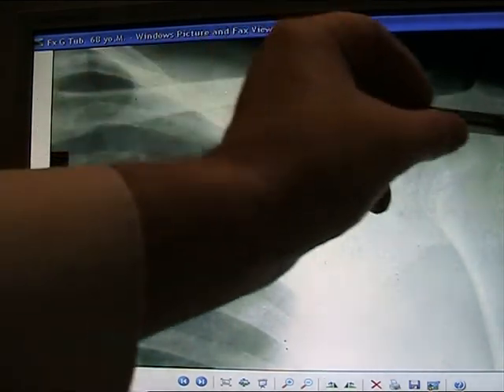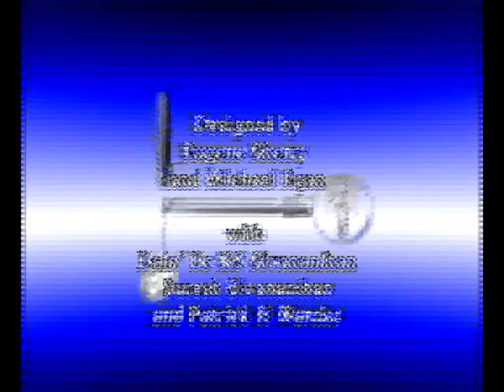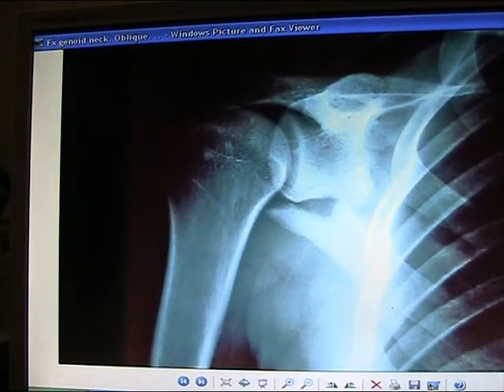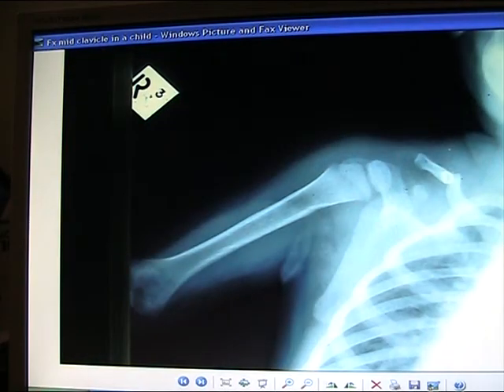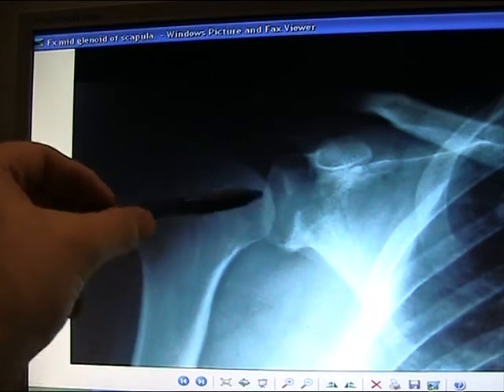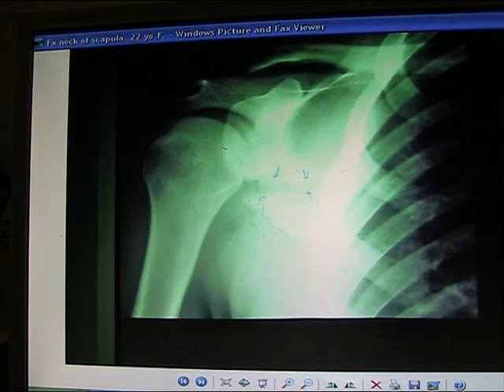Fracture of the greater tuberosity, you can leave these. Inferiorly, doesn't involve too much articular surface, you can leave that one. Surgical neck again. Fracture of mid-clavicle child, perfect remodeling, no operation. Mid-glenoid fracture, this will need open reduction, internal fixation. This is a large step-off deformity.